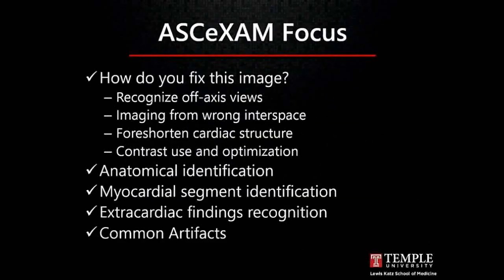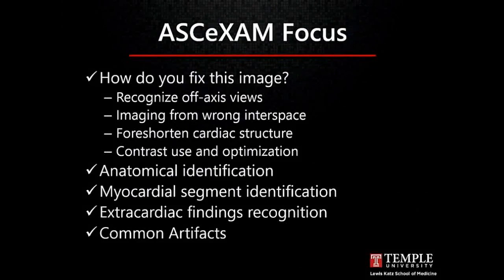So I try to, after every so many slides, bring you back to the exam focus. How on the exam are they going to test you on the things we just looked at? They're going to ask you, how do you fix this image? So you've got to recognize off-axis views. You've got to recognize that they might be imaging from the wrong interspace, or recognize that they're foreshortening a cardiac structure that might change your assessment of its function or pathology, or even test you on the contrast use or optimization to restore diagnostic accuracy in studies.